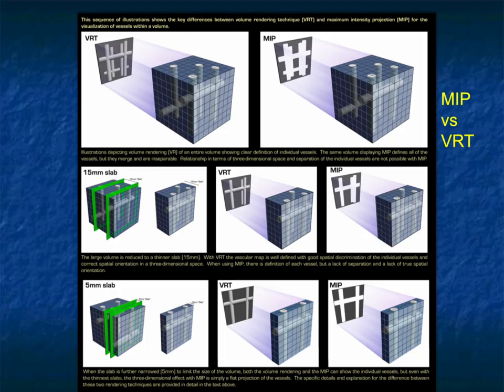The techniques of MIP and volume rendering, I'll cover them a little bit, but I think the biggest issue, and it's still the same, remember MIP imaging, I do like it for looking at the liver, and I do like it for looking at vessels, and I use it with volume rendering and cinematic rendering, but it's a projection technique, and what happens is it just projects the brightest structures. It does not take into account where things are in the volume.